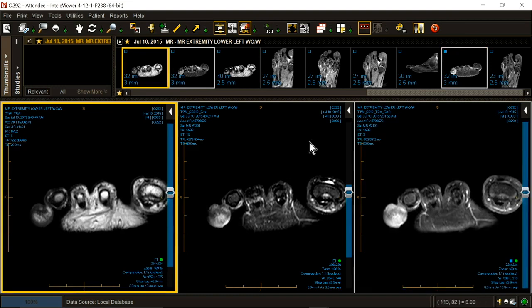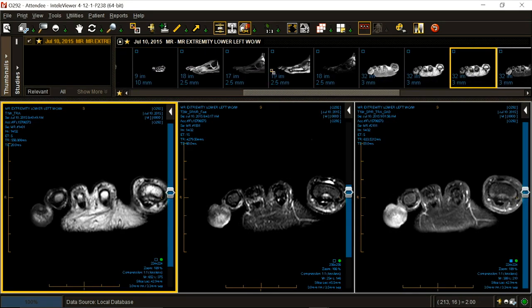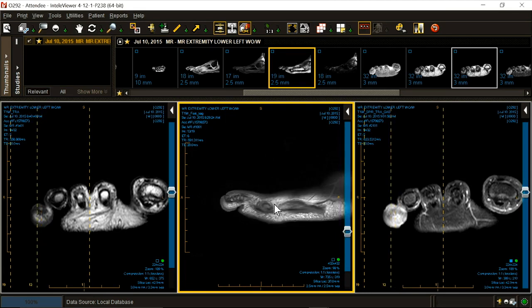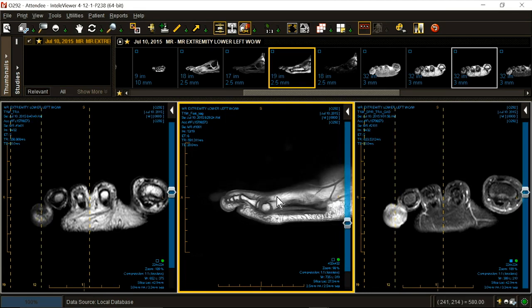Osteo or no osteo? Let's go to the long axis view. Sagittal T1, we said, was the ultimate, the penultimate sequence. Osteo, no osteo? No osteo. Done. Didn't need the contrast. Didn't need the water-weighted image. T1 solves it. Next.